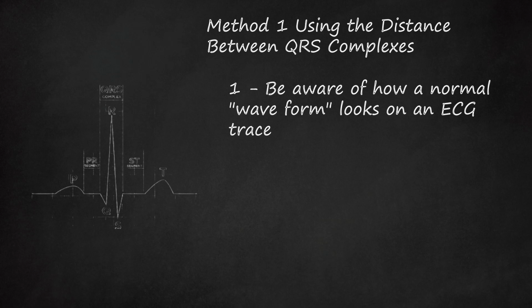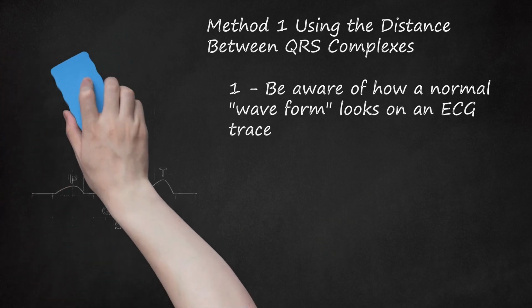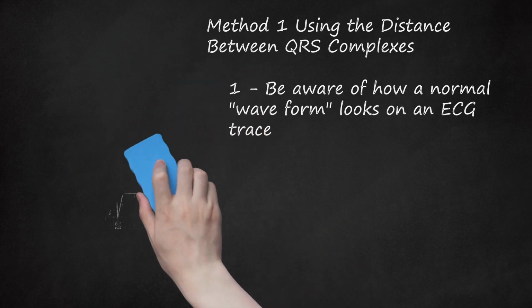The ST segment directly follows the tall QRS complex. It is actually the flat area prior to the next semi-circular shape on the ECG, which is the T wave. The importance of this flat segment, the ST segment, located right after the QRS complex, is that it provides important information to physicians about things such as potential heart attacks.